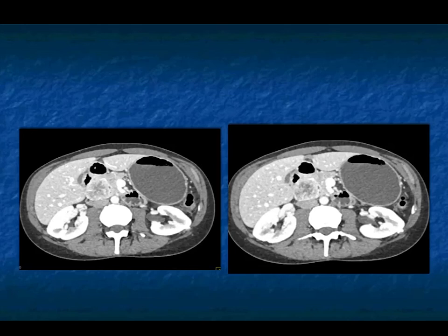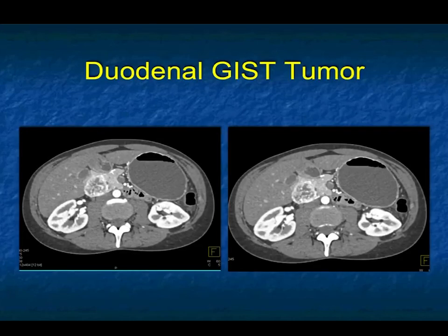This ended up being biopsied. You can see the mass, still vascular on the venous phase imaging, and was a GIST tumor. I like to show cases like this to make the point that sometimes it's not that easy saying if something is pancreatic or duodenal, and how the overlap between GIST and carcinoid and neuroendocrine tumor of the pancreas can be somewhat challenging.